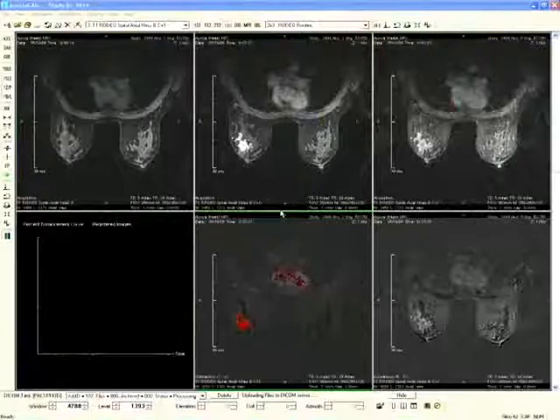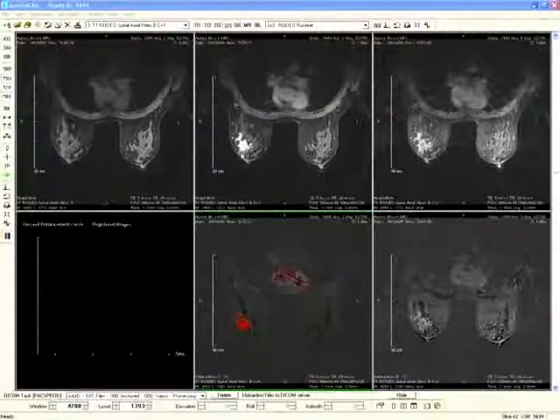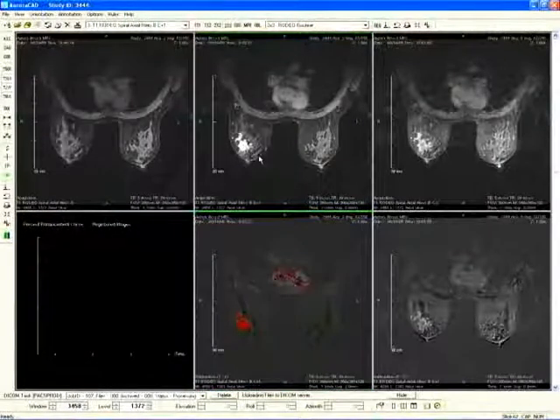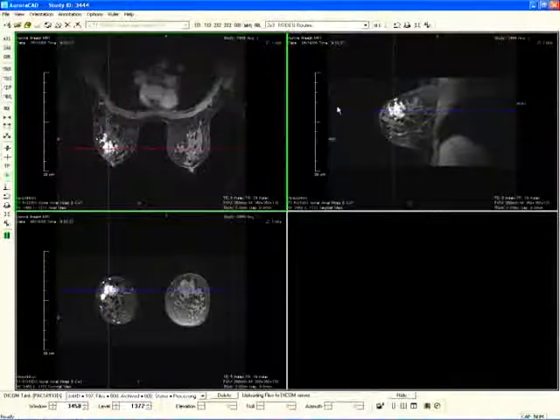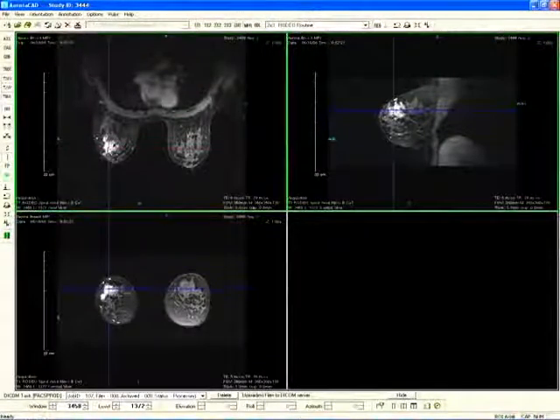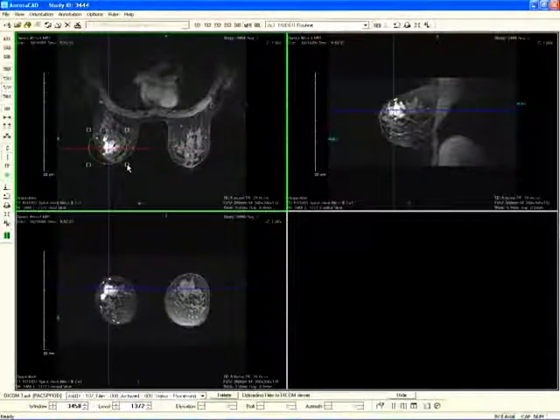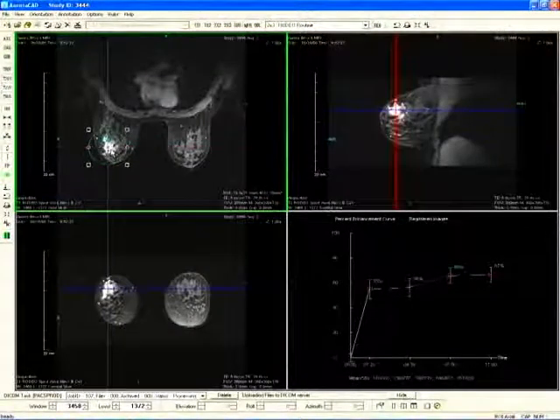This patient will have chemotherapy, so we need to know the original size of the tumor. This calculation would be difficult by linear measurements alone, but AuroraCAD has the ability to measure the lesion volume and surface area on a voxel by voxel basis. We start by going to the MPR tool and locating the axial slice with the greatest tumor area. We draw an ROI over the enhancing mass and make sure that it is large enough to cover all the region of enhancement in the mass.